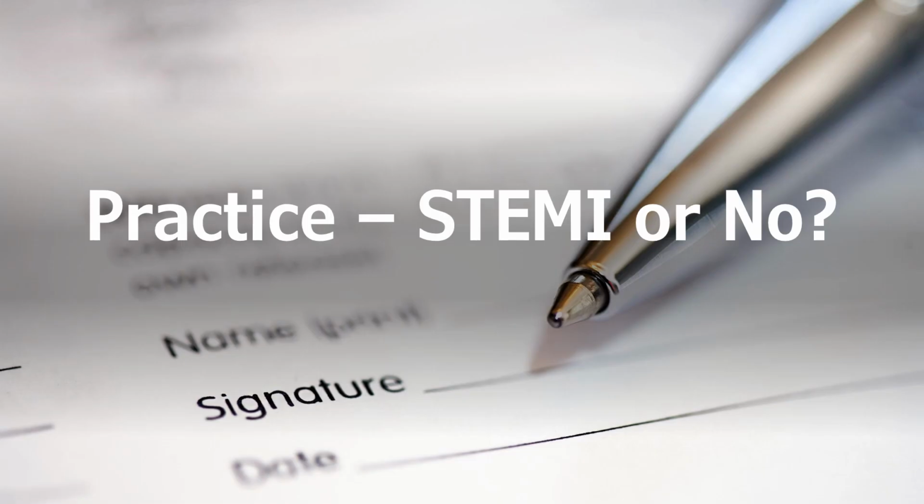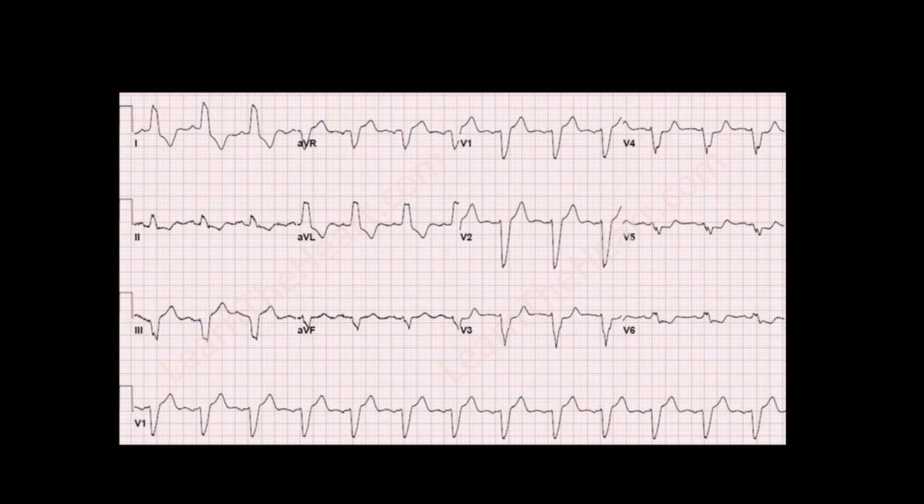Let's do a couple of practice ones here, just to see how you do. So take a look at that one and see, do you think that's a STEMI or not? You can pause it for a second so you get a chance to look at it. Scanning it, we see a wide QRS, we see some ST elevation in V1, V2, or I'm sorry, not in V3, but the QRS is wide, the ST segment is going with the T wave, and it's not greater than 25%. So this is just a normal left bundle.